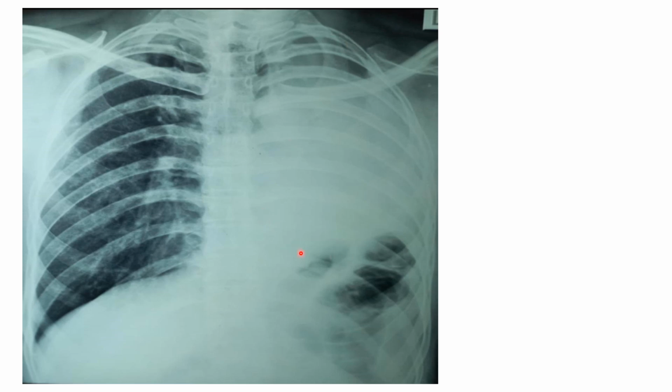When you remove the entire lung, the space becomes narrow or reduced in volume. And usually in post-pneumonectomy, fluid fills up this space. As I said in the last slide, nature doesn't like empty spaces. So once you remove the lung, fluid fills this space. But the unilateral lung volume is reduced. You can say that by seeing that the diaphragm is elevated, the cardiac shadow is shifted to the ipsilateral side, and the trachea is also shifted to the ipsilateral side. So remember this is a post-pneumonectomy X-ray.